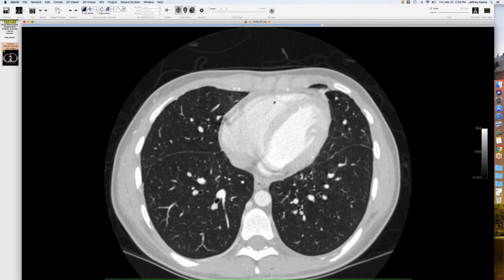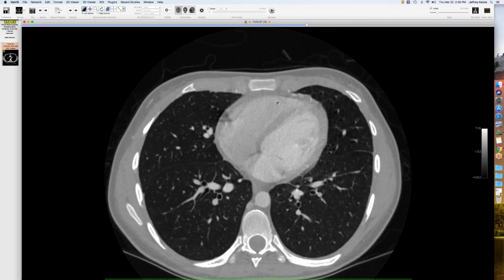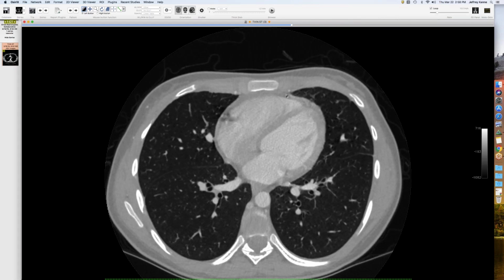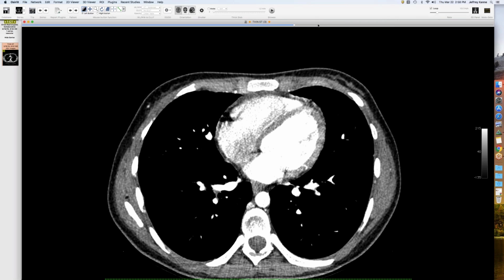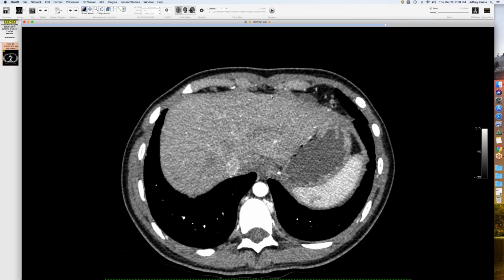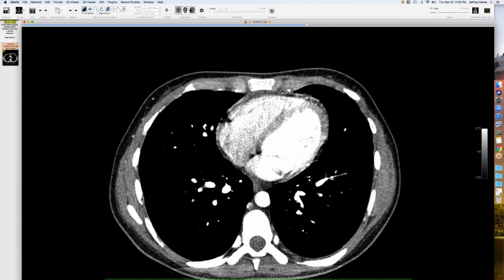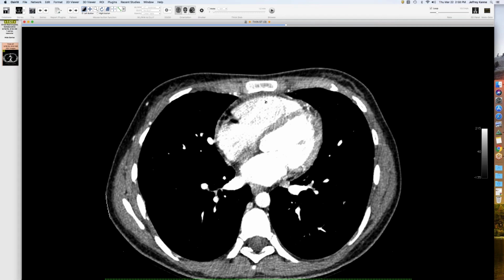So I didn't have a good explanation. What else is a little bit odd about it is you've got some abnormal vasculature even on the other side of the mediastinum, even out coming off the left internal mammary system. It just seems like there's more flow here than usual. May just be large intercostals, but it seems like there's maybe some here along the pericardial surface as well.